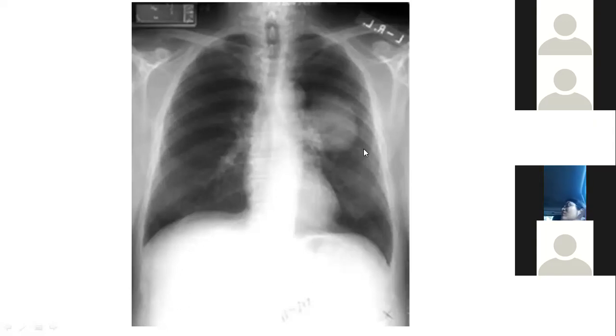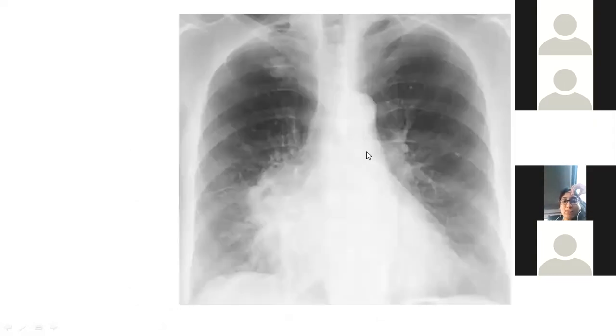So anything else? Any other point? Based on our findings, we saw that it has acute angles, so this is an intrapulmonary mass. Okay, this is an intrapulmonary mass. We'll come back to this X-ray later on. So we'll go to the next one. Yeah, what about this?